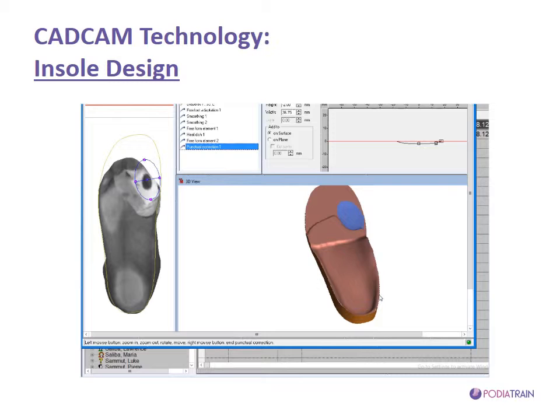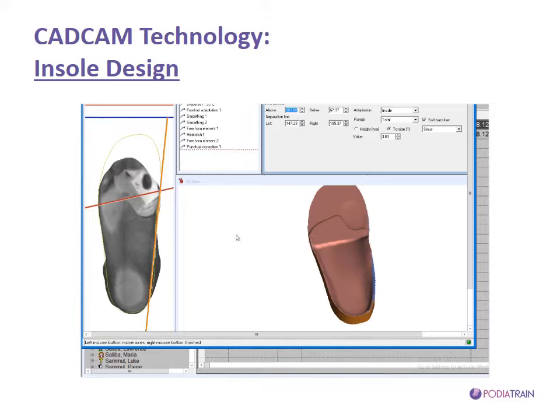In the final part of the process, considering that the patient has such severely pronated feet, but at the same time her feet are quite rigid, I'm going to insert a small amount of medial posting for the rear foot, or for the foot actually. To do this, I use a function called torsion. With this torsion function, we have these lines.